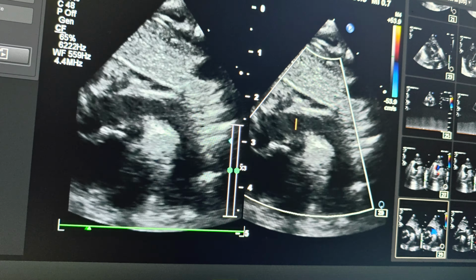So the flow is from right to left, because the right atrium is getting all sorts of blood, oxygenated and deoxygenated, both blood, so only mixed blood, and mixed blood is going through PDA to the descending aorta. So that is the scenario in this case. Whenever you find 3 branches coming out of the main pulmonary artery, the right one is the right pulmonary artery, the middle one is the left pulmonary artery, and the last one, the most lateral one, the most left one, that is the patent ductus arteriosus. That is the point to understand from this image.